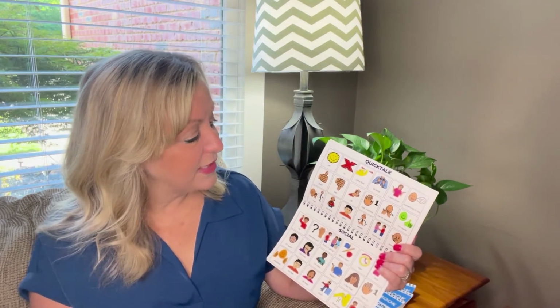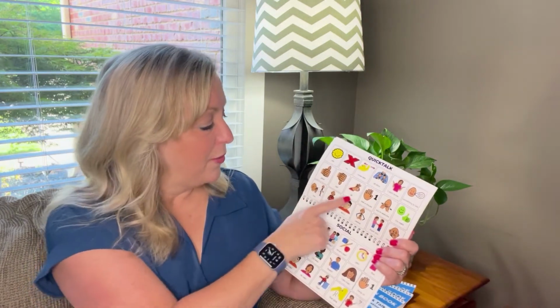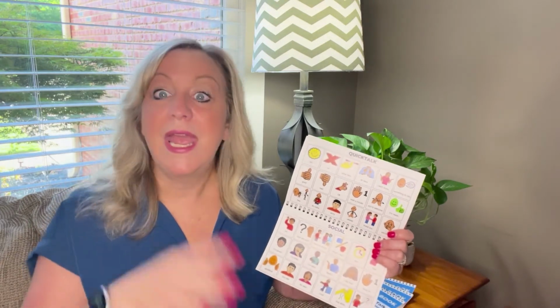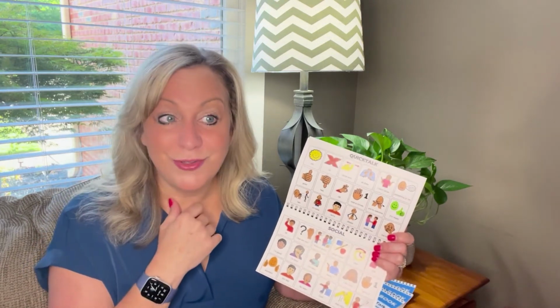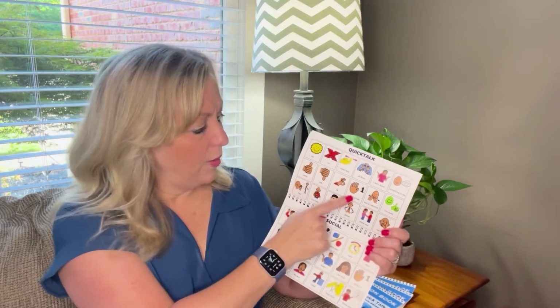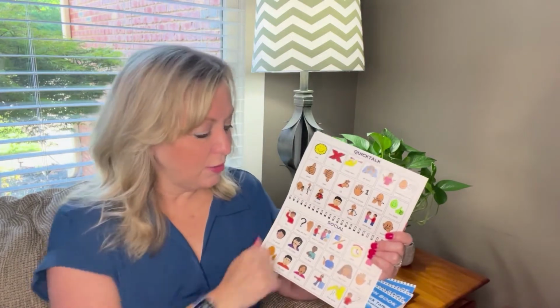Okay, so we also have things like, come here, all done. I don't know, I'm ready. Okay, oh, that's good or that's bad. Imagine someone walking into your room and saying, hey, we're gonna have a fire drill this afternoon. And you can go, okay, that's bad. Or wait a minute, I need to know what time that is. I'm ready, okay? So that's what our Quick Talk pages are.